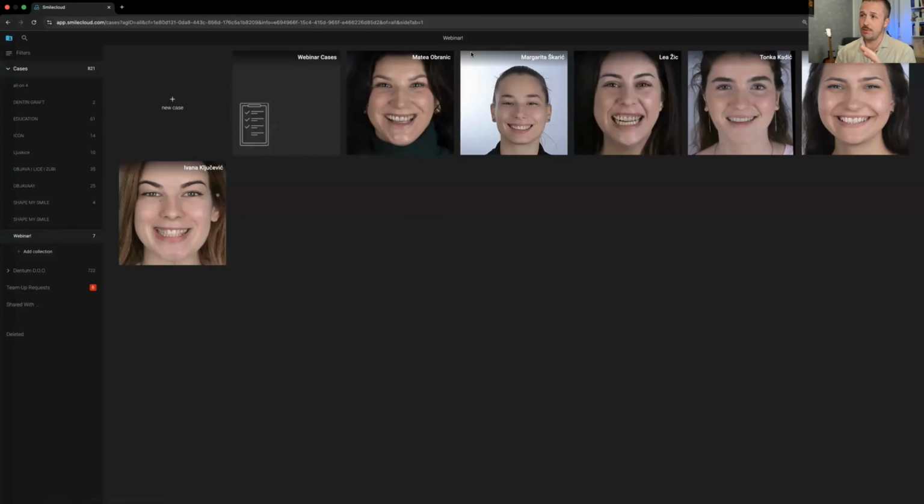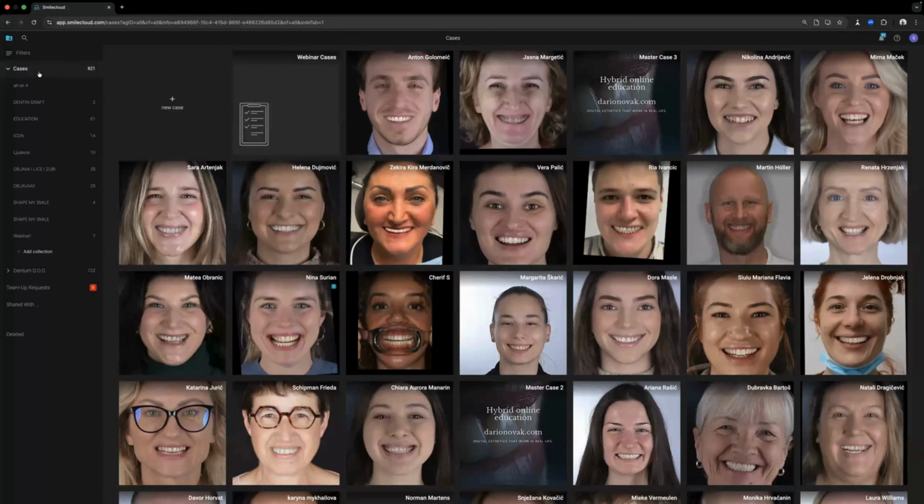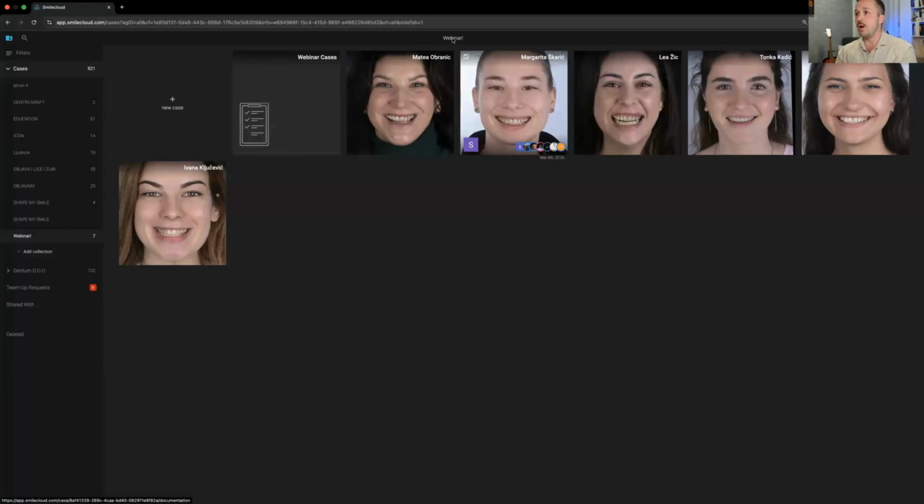I don't want to show all of my patients' cases, so I prepared a couple of them here. You can also find all of your cases, or some of your education cases, whatever you want. You can selectively see what you want to see.